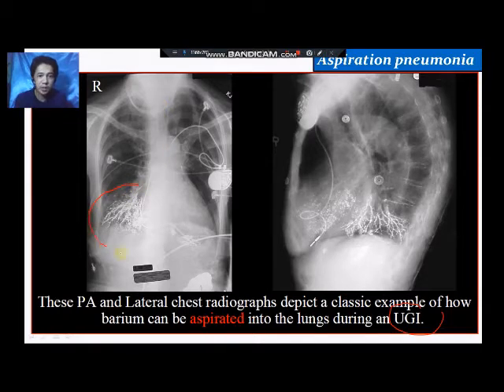So that is why we can see the terminal bronchus of the patient toward the alveoli, the air sacs. Okay, so this is a PA and then the lateral projection of the chest of the patient, in which there is barium sulfate in the bronchial tree, in the terminal bronchus. So of course, that can block off the airway, the air passage towards that lung tissue. Then of course, that will cause infection later on. Okay? So barium sulfate stays in your lung field, so it should be removed later on.